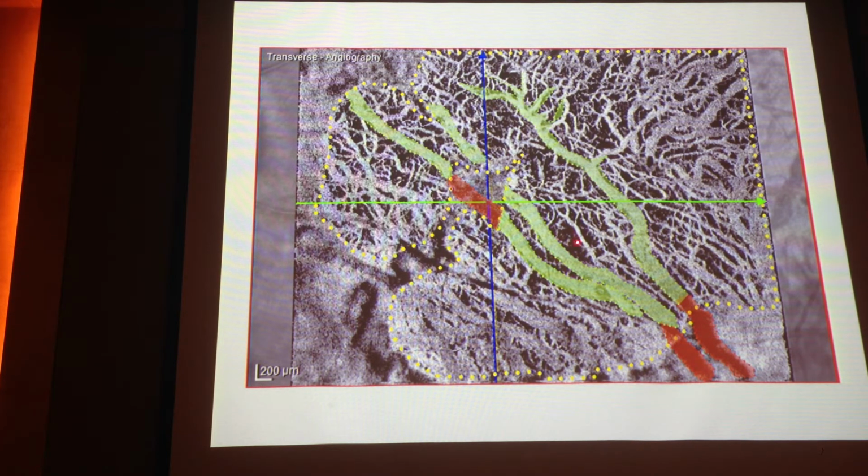Here we see dark between the white vessels because there is no choriocapillaris, so there is no projection effect. But there is this area. You see that here the vessel is dark, then of course no RPE, more light, it becomes white. But between this white vessel and white vessel there are some white things. So why do you see white here?